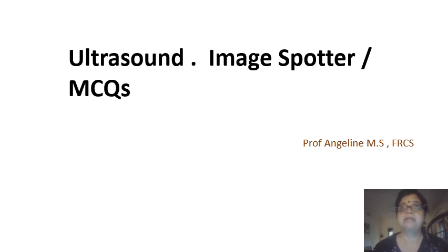Some students wanted specifically certain images, which they had difficulty with. A gallstone, gallbladder is the most common image they will keep for your NEET or your hospital. But I think a few papers had little tougher image spotters on ultrasound. So they wanted me to do a session on this and we will try our best to clarify certain doubts.